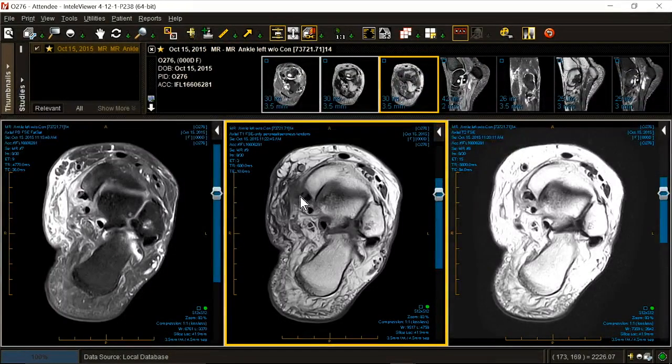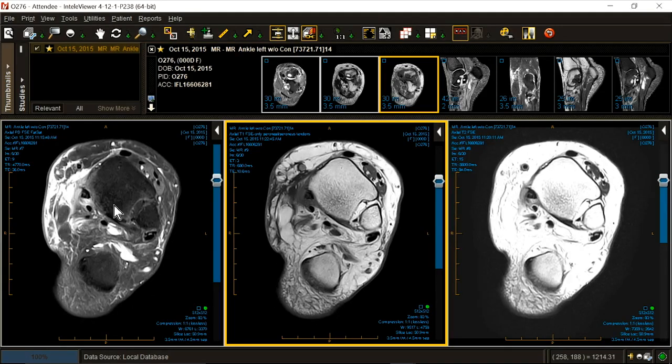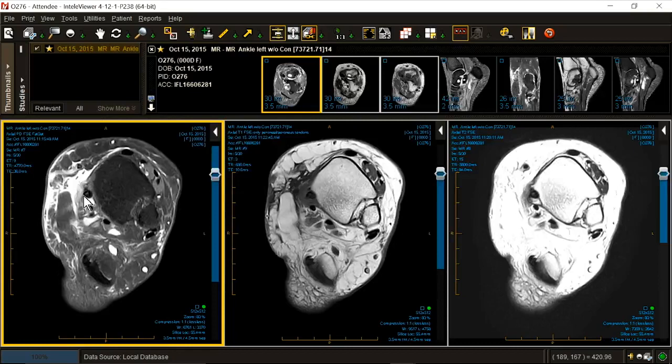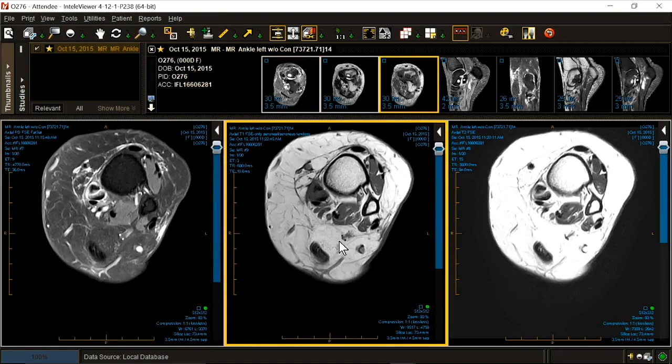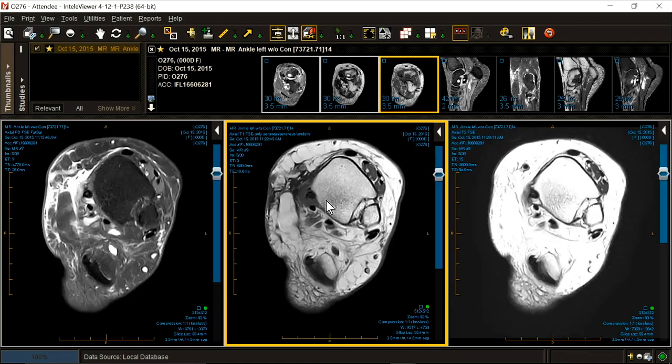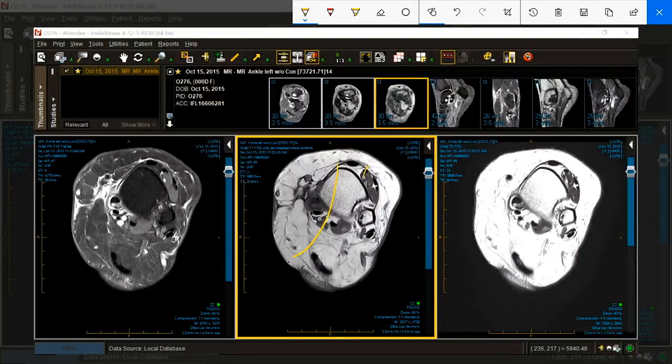Still split. Harder to see on T2, but still split. Still diseased, but not split. And what's this? A torn medial retinaculum. What is that? That's another piece of the tendon. So here's what happened. The back part of the tendon is sliced in half, and the back part has torn off and moved up proximally.